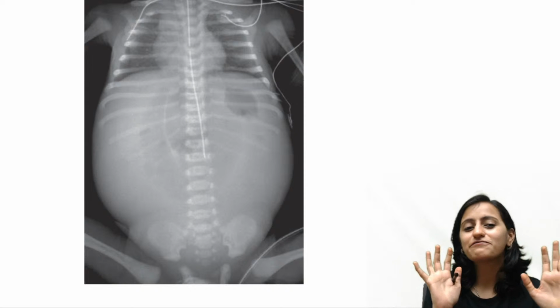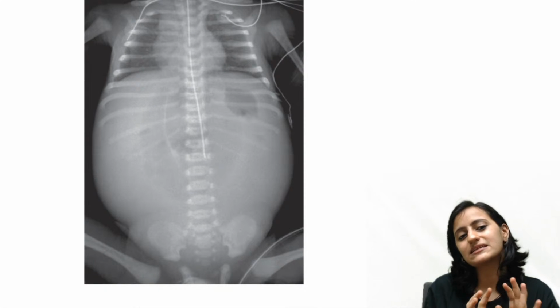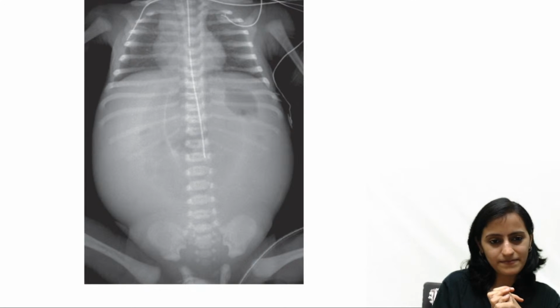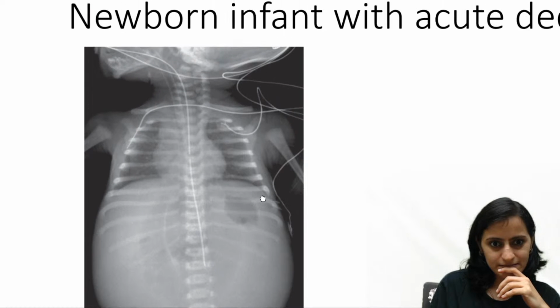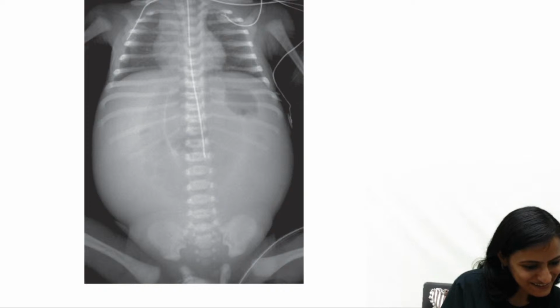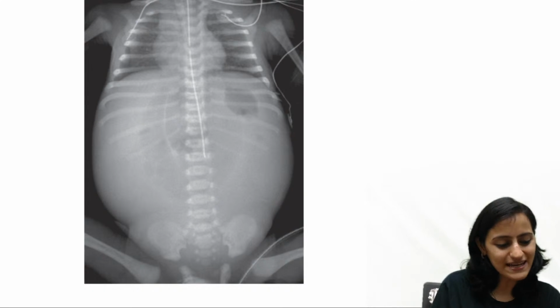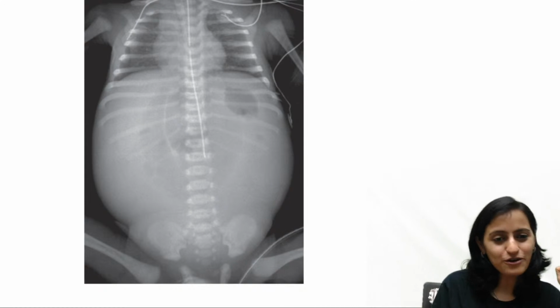So the finding, the pathology, is not in the chest. The pathology is in the abdomen. So another clue if you want me to give. Okay, very good. Rachna has picked it up. That is your football sign, which we can see. That is your football sign.